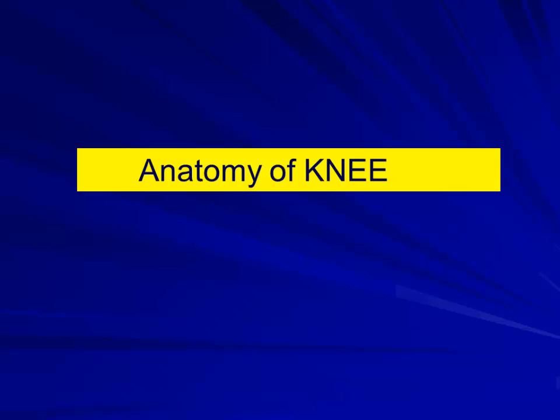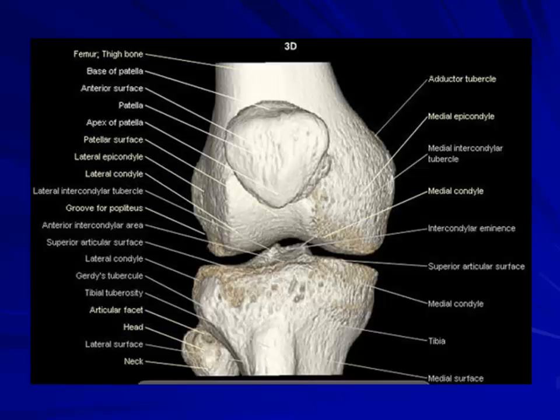Okay, welcome back. This is probably a short talk, and we'll look into the anatomy of the knee. So it's a very important weight-bearing joint, and most of the pathologies are related around the knee joint. So we look at the patella.